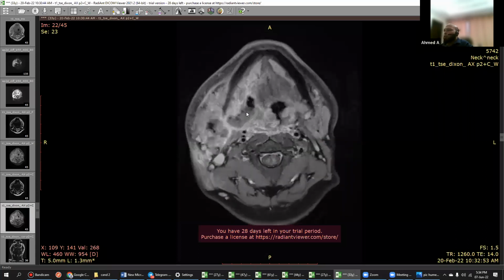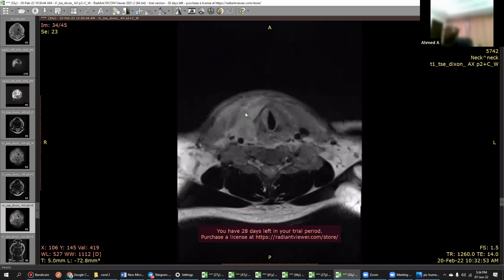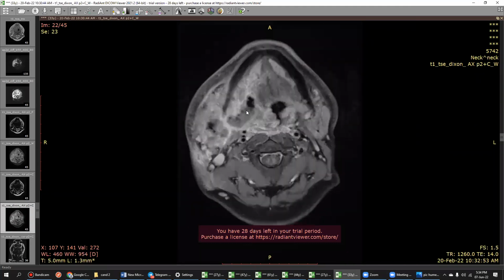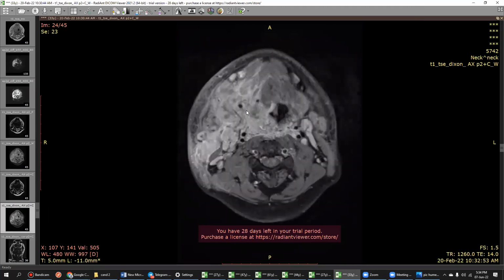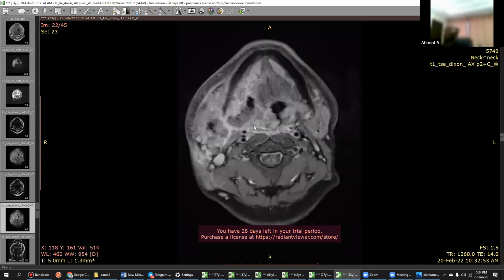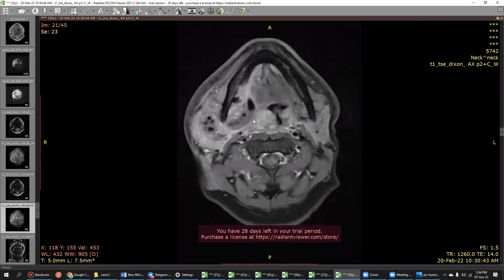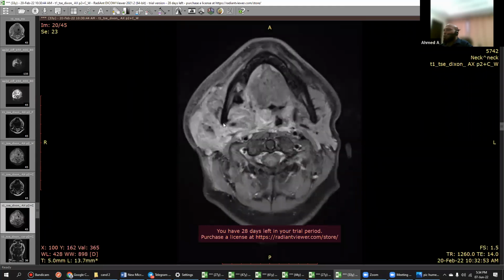And what are all these? So where is the focus of infection? In the neck, usually. Have you heard of Ludwig's angina? No, what is Ludwig's? Ludwig's angina is an infection in the submandibular region which extends into the neck. It's a medical emergency. Yes, this is Ludwig's angina, but it is a very severe case, which is crossing the compartments.